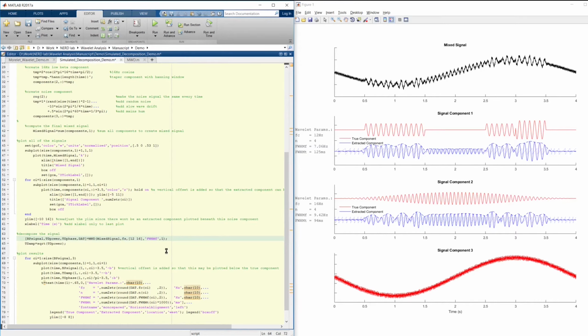Very, very narrow. And now we're doing quite a lot better in certain respects, particularly in the case of the beta component. We've captured the smooth hanning window that was applied to that 16 hertz component, but in the alpha component, now we're looking quite poor again. But rather than picking up energy from other frequencies, now what we're doing is we've actually lost all our temporal precision. So the sudden energy change in the alpha component has now been smoothed over. Rather than a boxcar shape that we would hope in the amplitude, we have a very smooth, approximately Gaussian shape. Also, this phase reversal was registered about 100 milliseconds early.